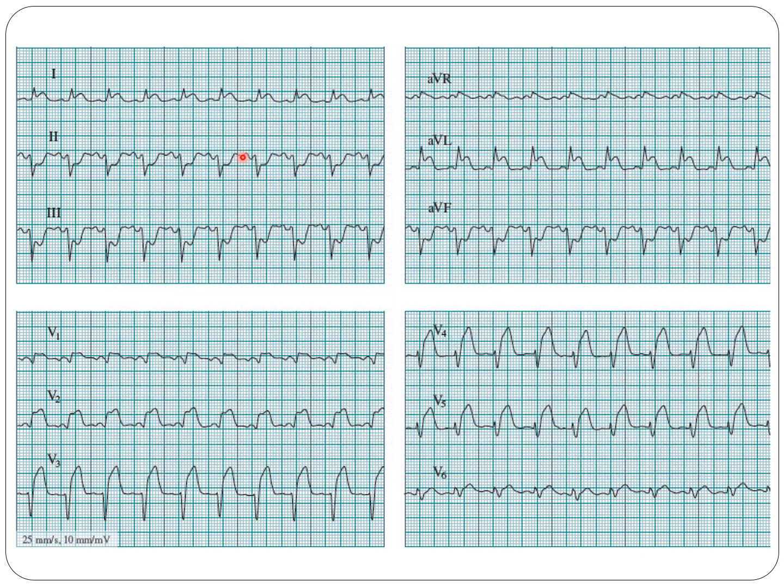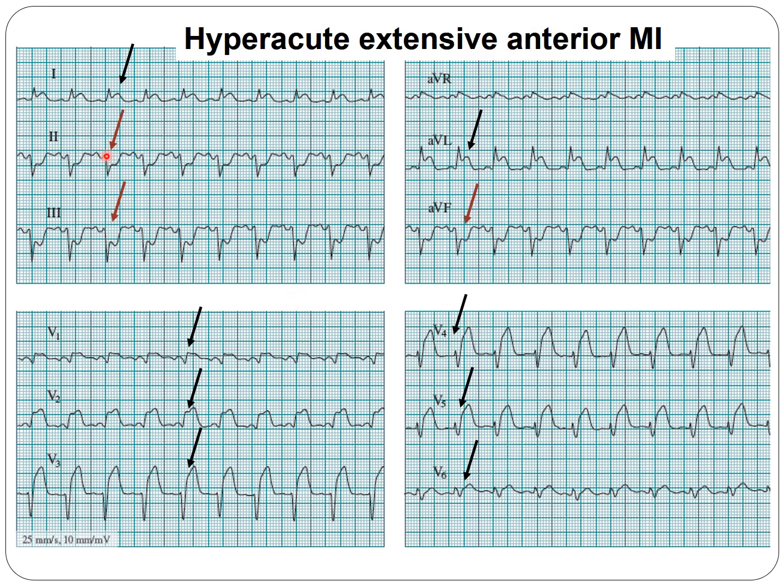Now, by looking at the QRS complex, the pathological conditions, first of all, we do see in the chest leads V1, V2, V3, V4, V5, V6, an R regression and the ST elevation all the way up to lead number 1 and AVL, because we do have this dome-shaped ST elevation that represents an extensive anterior myocardial MI. In the opposite leads, for example 2, 3, and AVF, we do have the reciprocal changes because AVL is almost opposite to lead number 3. So the high lateral lead can be causing a mirror image in the inferior leads.